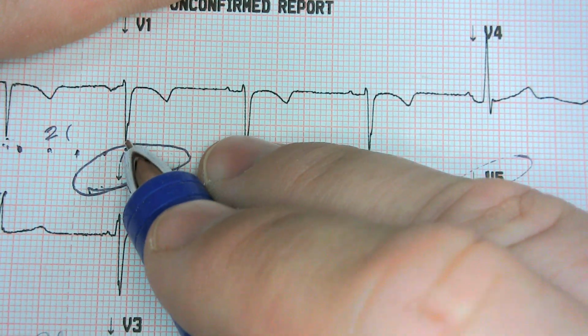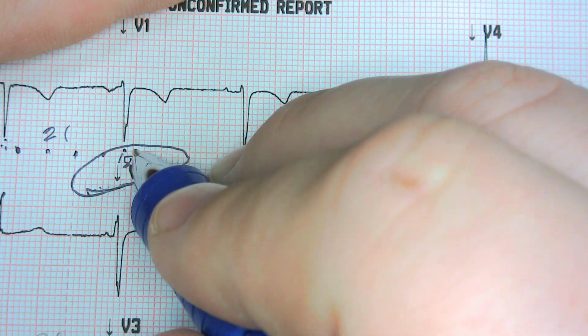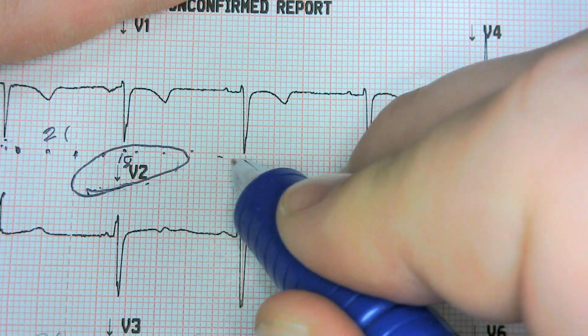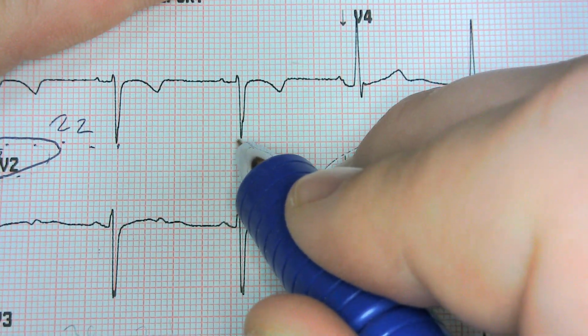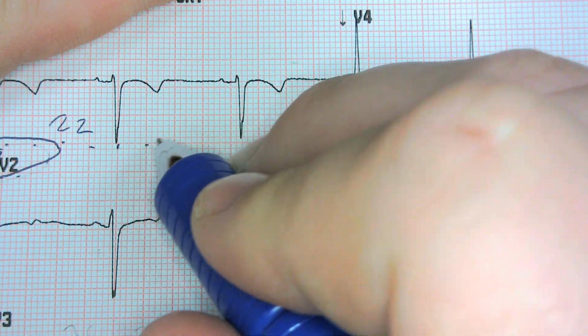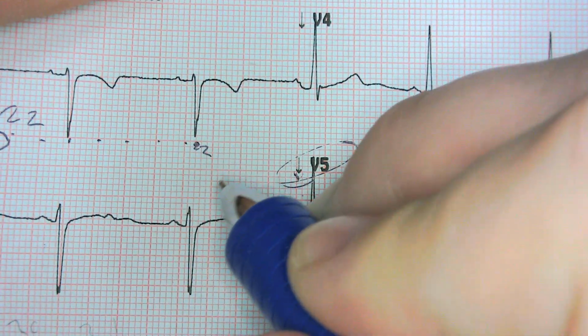All right. So down to down right here. We're at 0. We haven't gone anywhere. All right. 5, 10, 15, 20. And then 2 over here. We're at 22. All right. Down to down. All right. So 0. We haven't gone anywhere. 5, 10, 15, 20, 22.